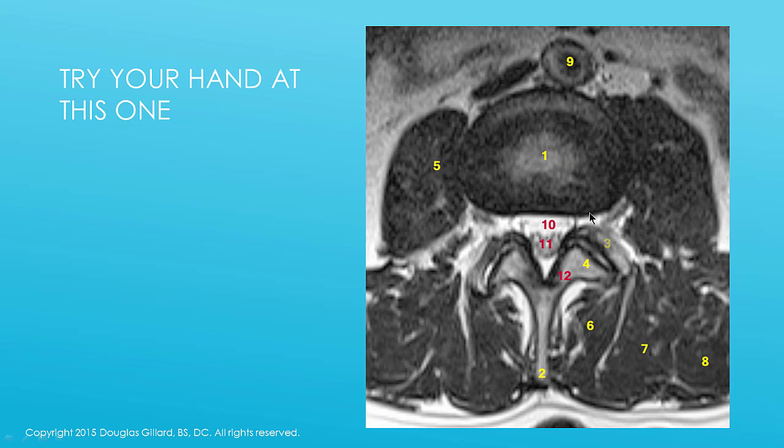I'll just be quiet for a minute. You can pause it. This is actually an interesting image. Okay, let's see how you did.